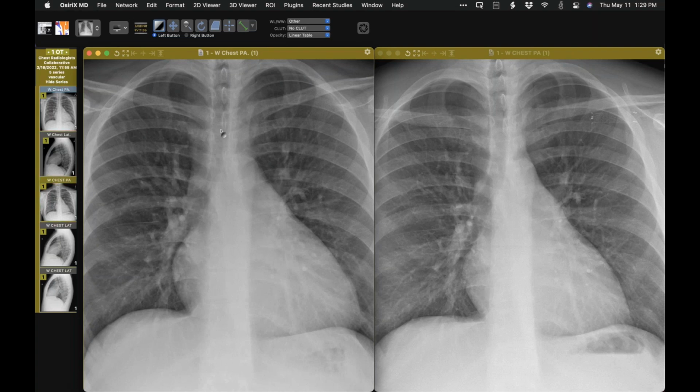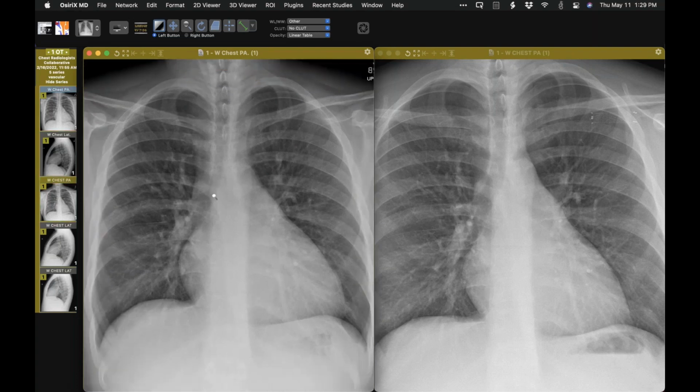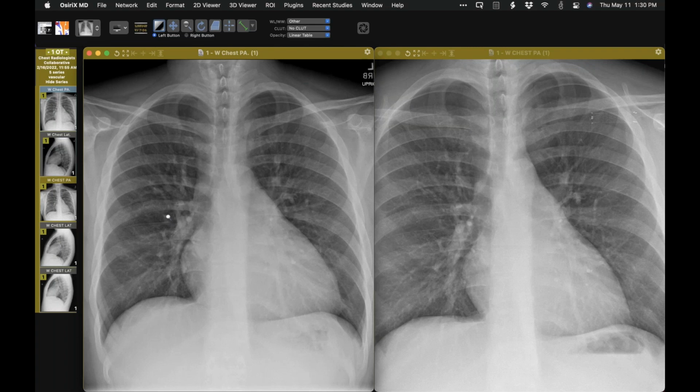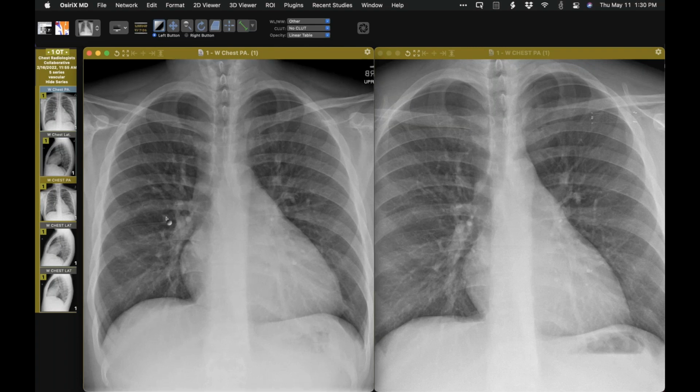So this is a really nice example of hypervolemia in a renal failure patient. You can see there's a stent now more recently, but those findings are not present on the recent one. I use this to teach residents about findings of hypervolemia, old style analysis of radiographs. I thought you might like that, particularly if you're a trainee. No lung edema, but just hypervolemia. Okay, Jeff, those are mine.